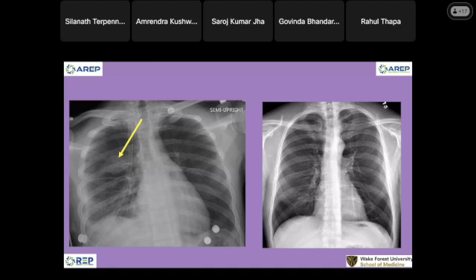This is post-processing image. This is the routine lung air that we normally see. We will see a subtraction where we subtract the bones out, and another subtraction where we subtract the lung out and see only bone. So it could be a mass. What I say is we process two more images, so we will get three images from one shot, and then this is her lateral.